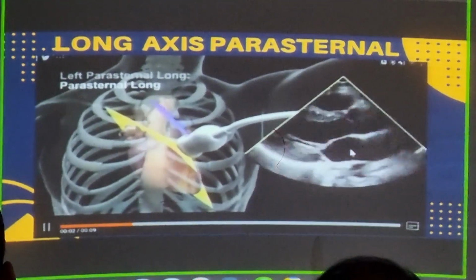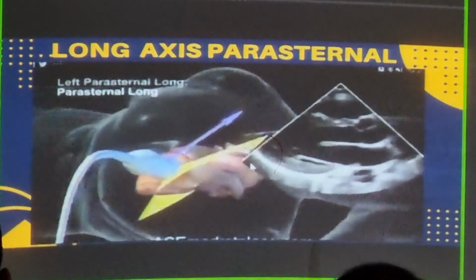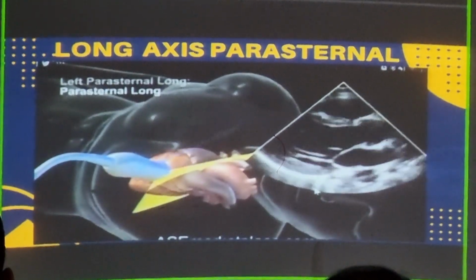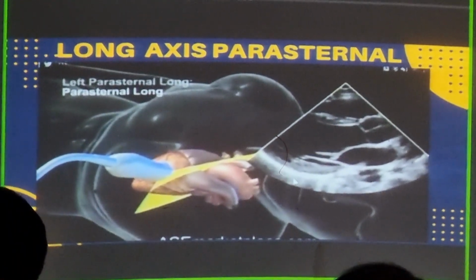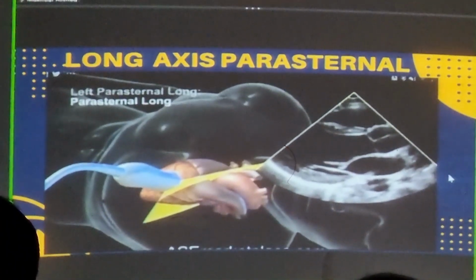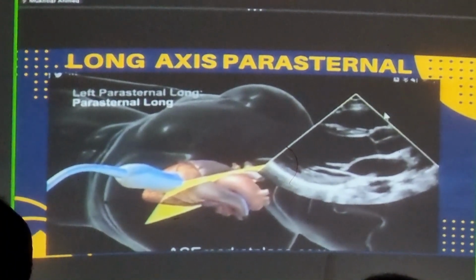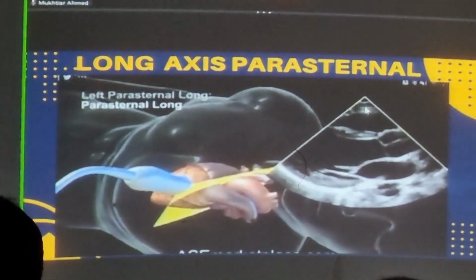If the fluid is present below the descending thoracic aorta, meaning it is somewhere around here, and the glistening white pericardial membrane is clear and white, that means it's coming from the pleural cavity. I will show you what I mean. We'll have a look at it once more and then we'll move on to the next slide.